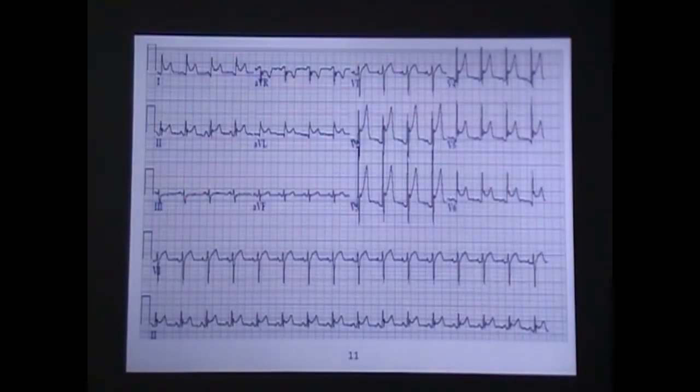All right, what do we see here? Jumping out at me, because I start on the left always, I've got some changes going on here. I jump down, V6, V5, then I'm going, uh-oh, V4, V3, V2.